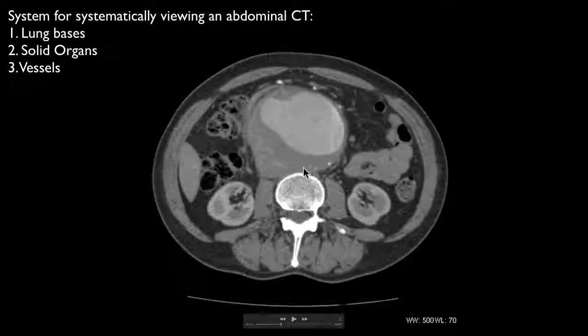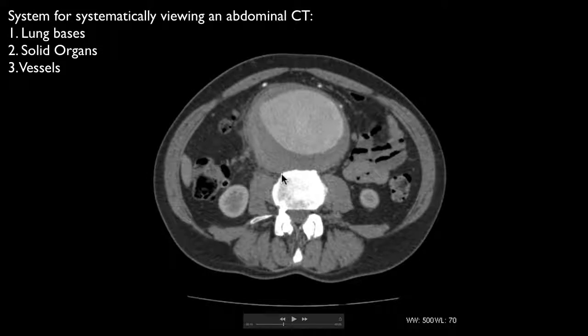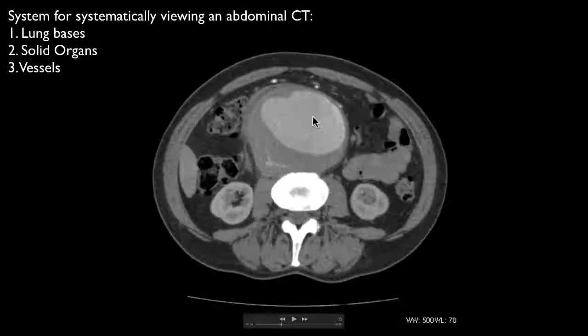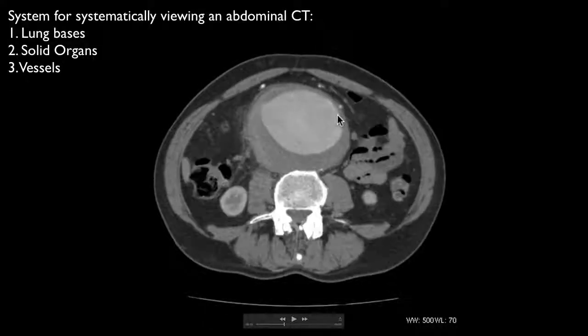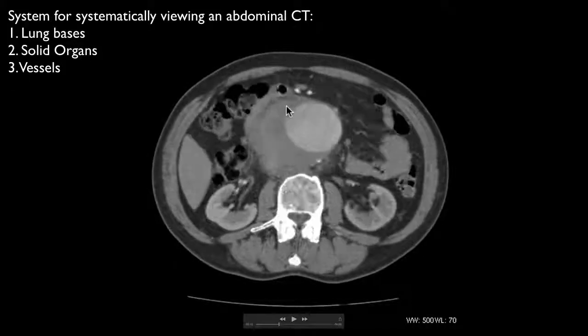There are various other secondary signs of rupture. So you have impending rupture. You'll have the aorta draped over the vertebral bodies at the back here. So this is one of the lumbar vertebral bodies. You can have an odd morphology to the aneurysm sac. Sometimes you have beaking, or if you've got calcification in the wall of the aneurysm, which you often have, an interruption of that is often a sign of impending rupture. But obviously, clinical findings like a tender aneurysm are equally significant.